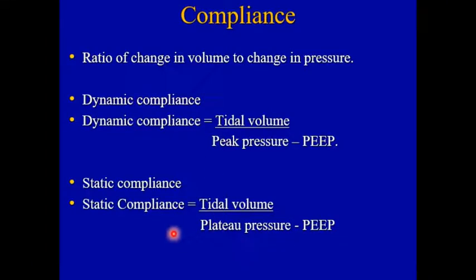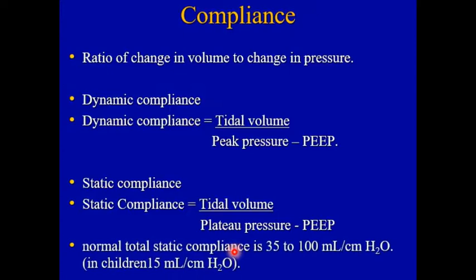So this is the difference between dynamic compliance and static compliance. Normal total static compliance is 35 to 100 ml per centimeter of water in an intubated patient. In a patient who is breathing spontaneously, the compliance of the lungs is 200 ml per centimeter of water.